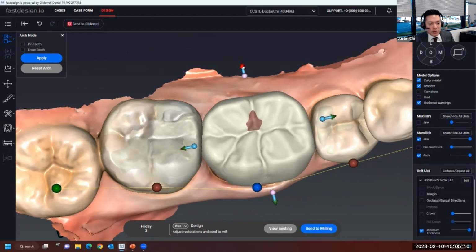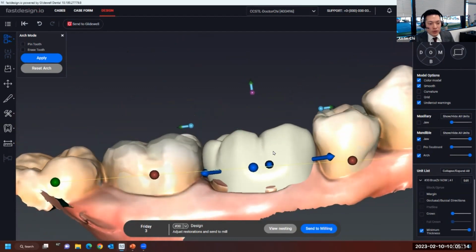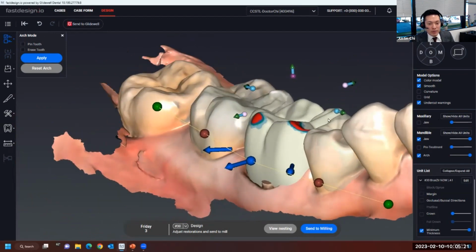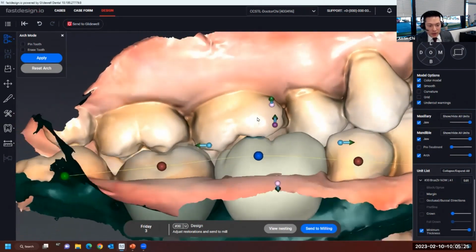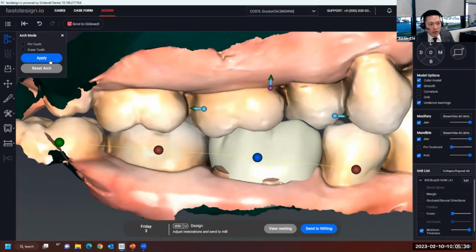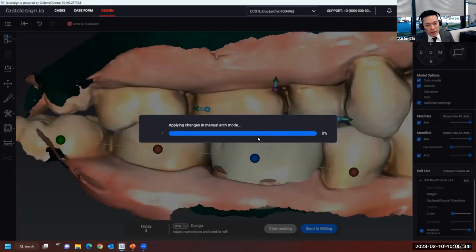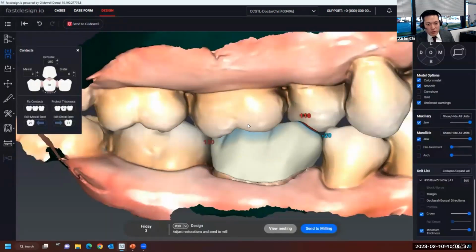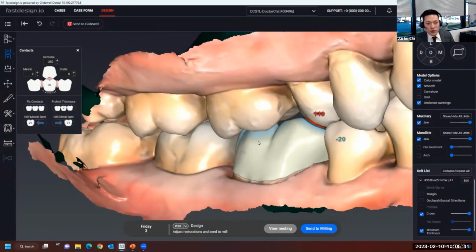And it seems challenging, but it really isn't. You just take an already pretty much perfect anatomical tooth, and then you can see how, if you position it toward the occlusal, it engages the opposing. And this is that functional aspect that I mentioned at the beginning. So even though it's real heavy at the moment, I just want to start off with a basic library tooth. So I like this position. We can set the size, angle, and general position over the prep. And so this is defining that initial starting point.